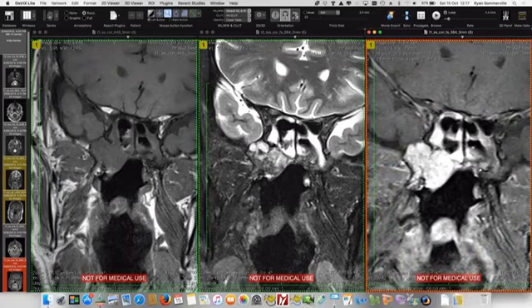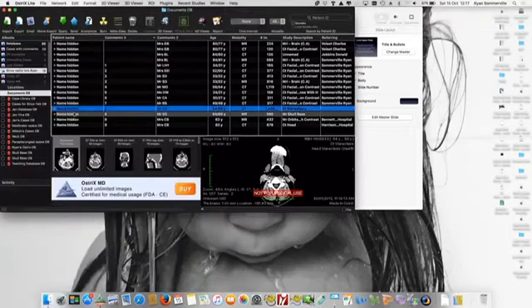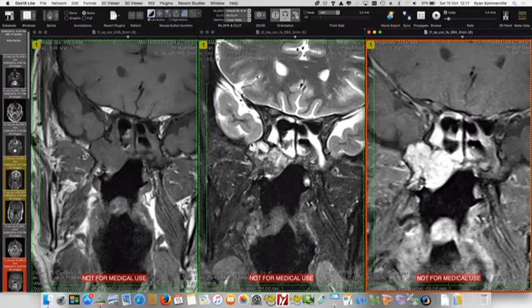There was no chance for embolisation, unfortunately. But then if we look at the CT, the other thing that's important is that you can see the demineralisation and infiltration of that bone. What I do with these cases, I always talk to Jen or Mitesh about these sort of cases to basically say, look, I know I can do all this stuff here. The question is that little bit there, and I'm trying to understand, is there a dural plane there? And these guys have to make a call on it quite a lot, but to be honest with you, they're mostly correct.